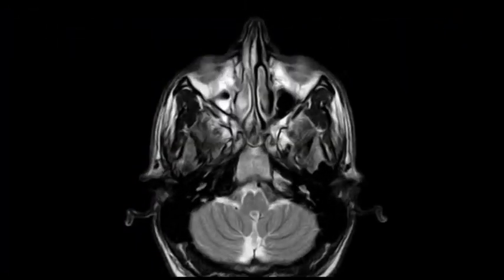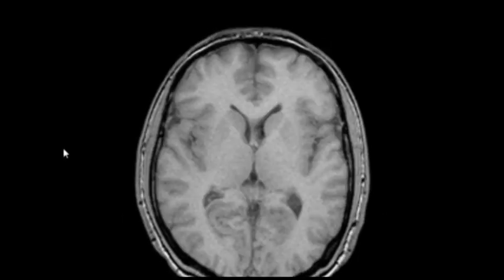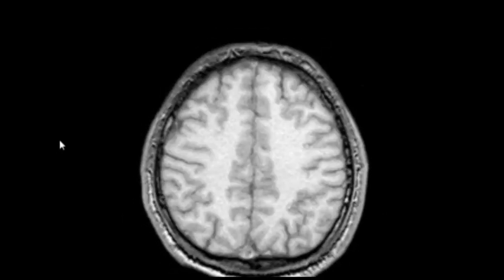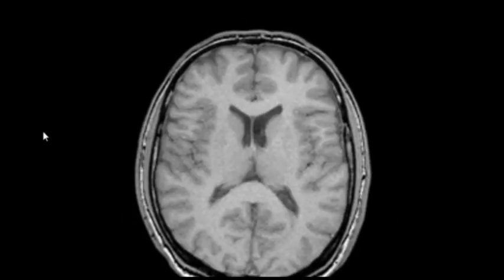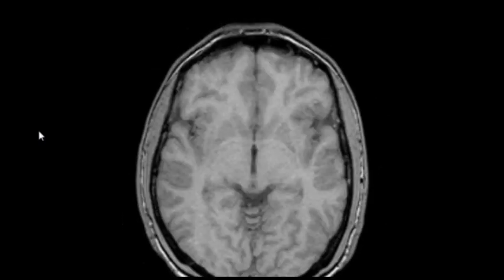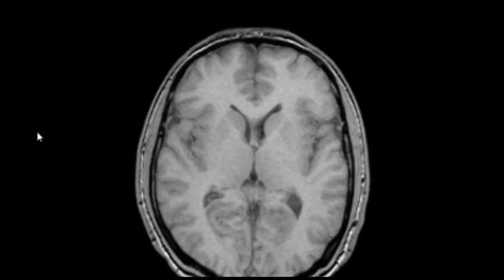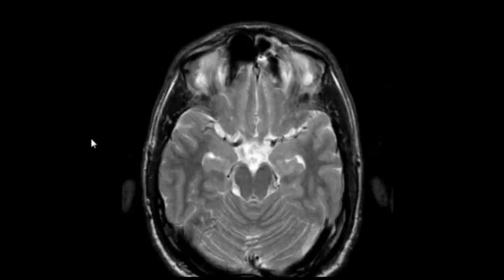I'm presented with an MRI of a 30-year-old male patient with multiple recurrent attacks of fits. I'm scrolling through the sequences. This is T1. T1 axial, coronal, sagittal? T1 axial, with or without fat sat? Without fat sat. Good. This is T1 and this is T2.